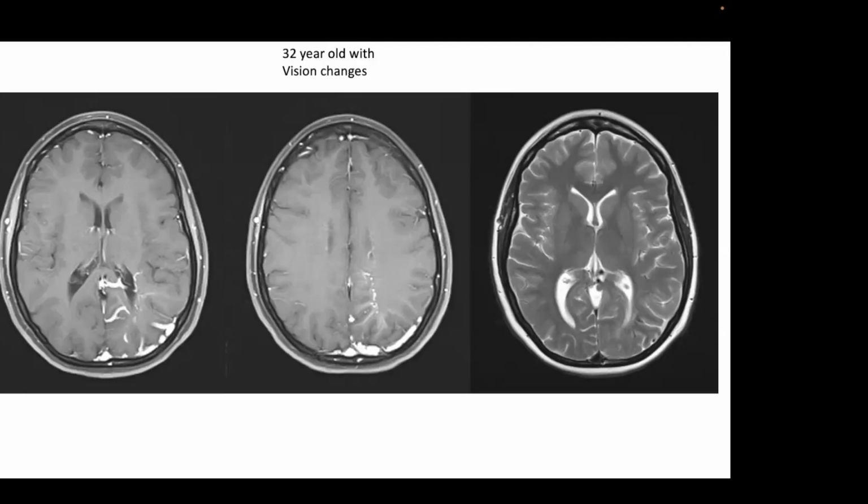It looks like there are a lot of blood vessels. They all enhance after administration of contrast. I don't see any flow voids, and there's no abnormal signal in the brain. And I see a bunch of little vessels as well. And the attending might say, well, that sounds a lot like a developmental venous anomaly, right? I mean, it sounds like a DVA.